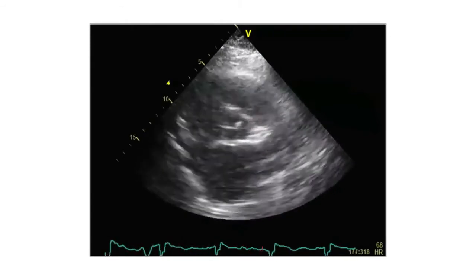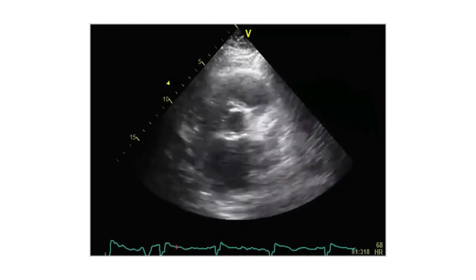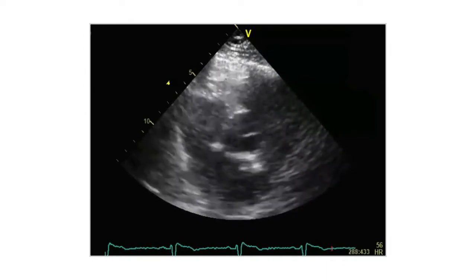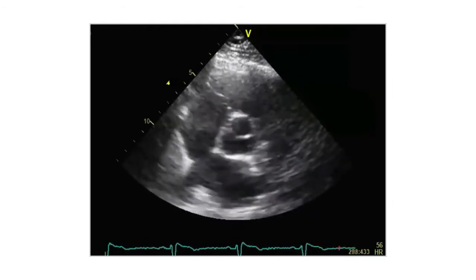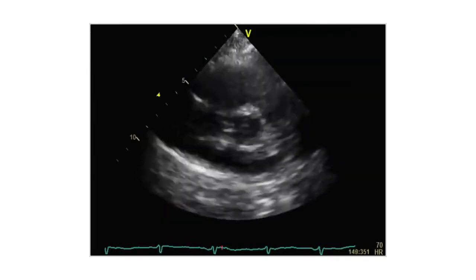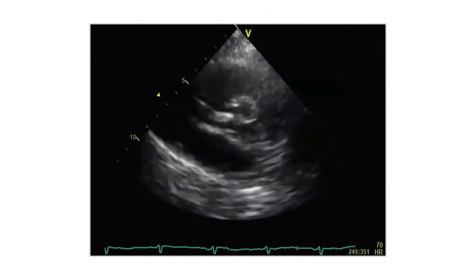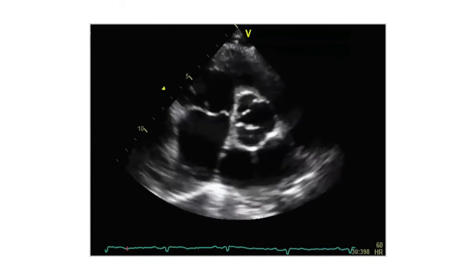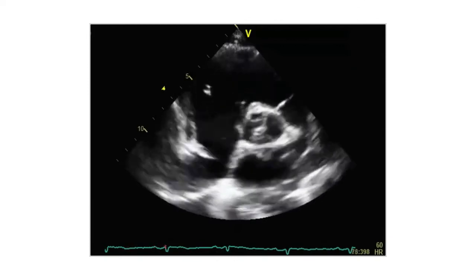Here's one aortic valve. Look at the cusps and motion. Here's the second example. Look at how the aortic valve opens and closes. And make your choice in the meantime. Here's the third example. With again, aortic valve, not really easy to say. This example. And the last one. So this is the fourth and last example.